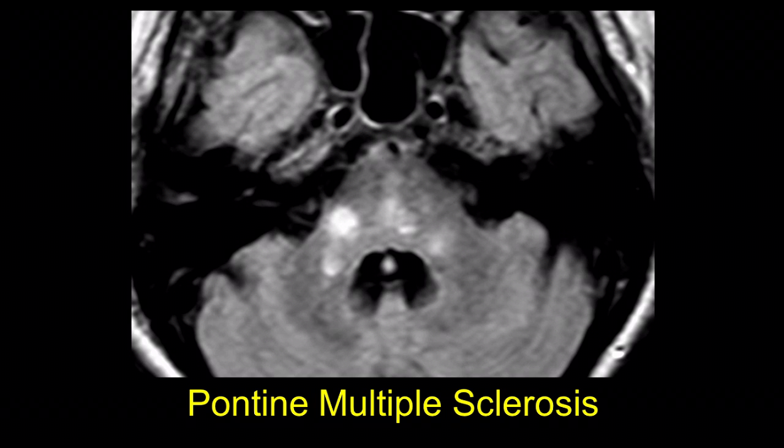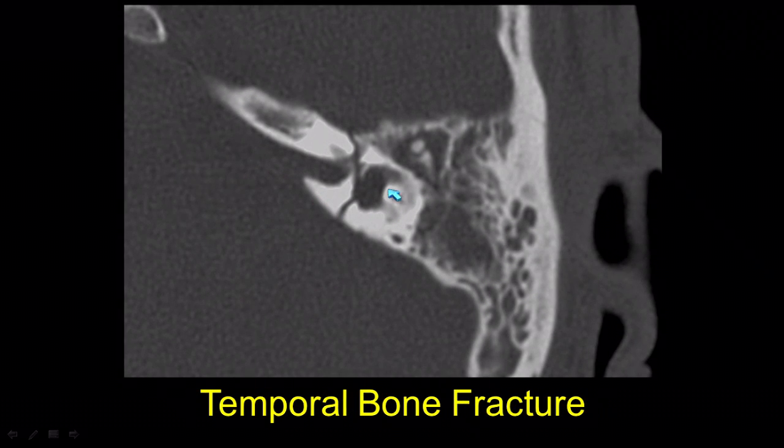If we have multiple sclerosis, if we have an MS plaque near that location where we think about those fibers of 7 coming out the ventrolateral pontomedullary junction, or if we have trauma, if we have fractures, we think about longitudinal and transverse oriented fractures, but we know that the transverse theoretically is about a 50% chance of hurting the facial nerve because it has this tortuous course. And we see here that short 4 or 5 millimeter section of the labyrinthine segment of the facial nerve. We have a fracture right through that itself.